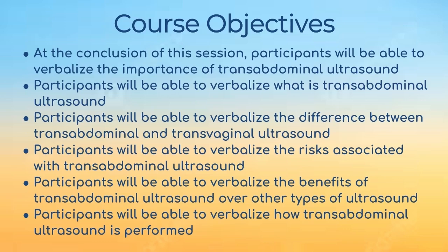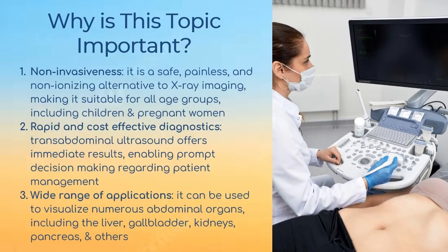So transabdominal simply means through the abdomen. This topic is important because ultrasound is a non-invasive tool that we use to visualize inside the patient's body in real time. It's a safe, painless, and non-ionizing alternative to X-ray imaging, making it suitable for all age groups, including children and pregnant women. It's rapid and cost-effective diagnostics. Transabdominal ultrasound offers immediate results, enabling prompt decision-making regarding patient management and a wide range of applications. It can be used to visualize numerous abdominal organs, including the liver, gallbladder, kidneys, pancreas, and others.